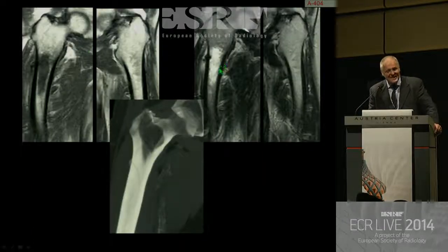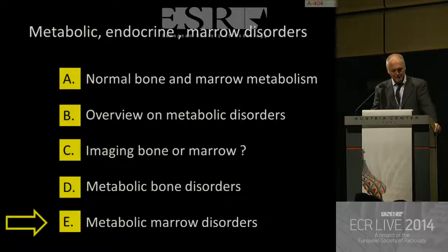This is misleading. You always, in that area, have a huge marrow change. I don't know why, but it's quite frequent. So MR leads you to a marrow condition. Please look at the CT and you will see the fracture line, which on this image is located in that area. Not recognizable unless you have seen it once. So I am sure you will see it within the next week. It's quite frequent in our elderly population.